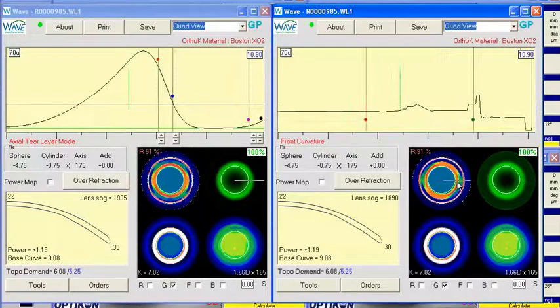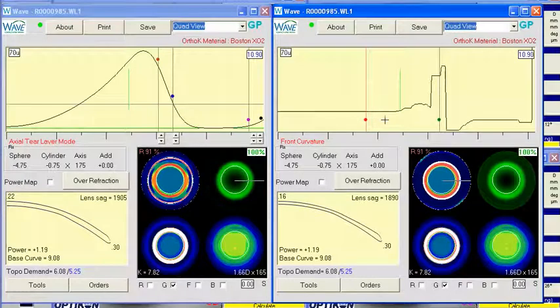And then I'm going to go to the front surface, and I'm going to drag the front OZ all the way down as far as we can. It's not going to go all the way down. So you'll see it reduced the center thickness, also took some of the mass off this lens. I would keep the edge thickness at 30 and see if the lids will help squeeze that lens upward a little bit, the upper lid.